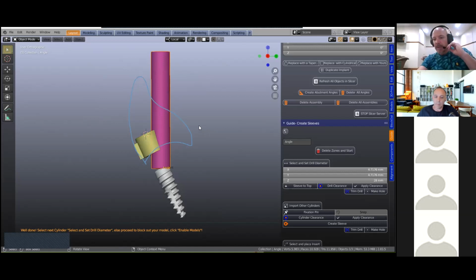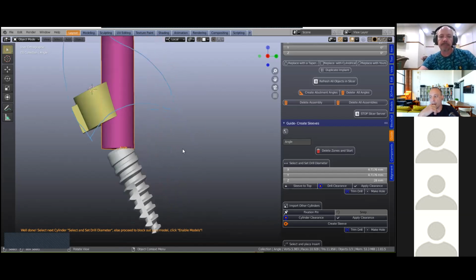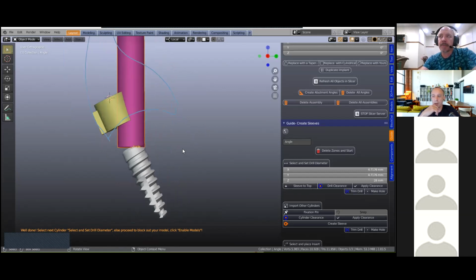Good, I think that answers that. There's a good question here. Can we add an extra circular cervical ring at the bottom of the crown? So is this something you've already got in the model designer that you've hidden away? You've got an extra cervical margin line. Mm-hmm. I'm not sure. I'm just going to open up the mic.